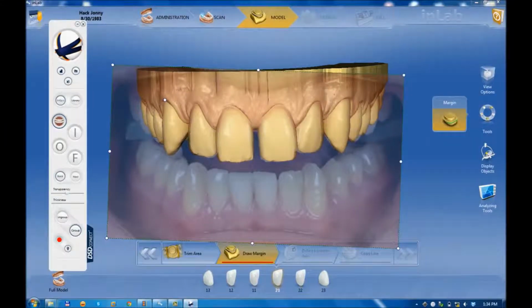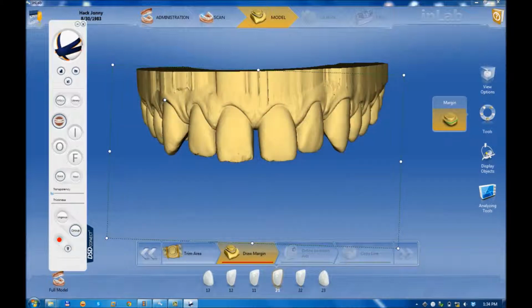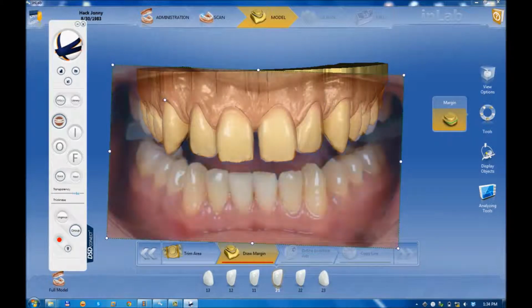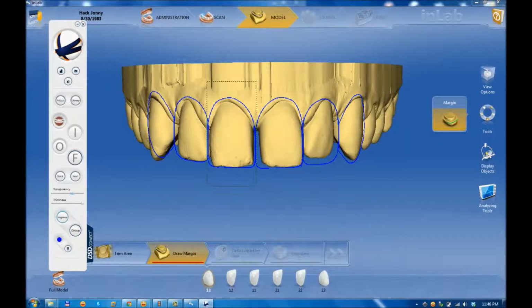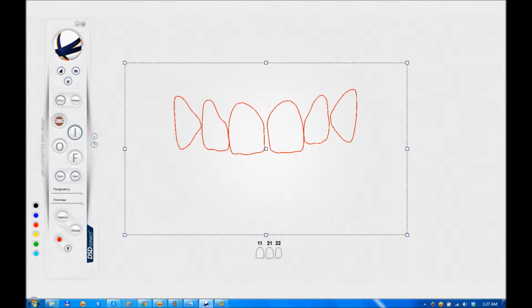The selection of the transparent bar helps obtain the desired and needed transparency of the images in work. Using the transparency tool, you can adjust the level of transparency of the DSD image that is overposed on the model in work in progress. The control over the thickness of the contours is done from the thickness selection bar for each separate contour. The color of each type of contour can be modified according to preferences.